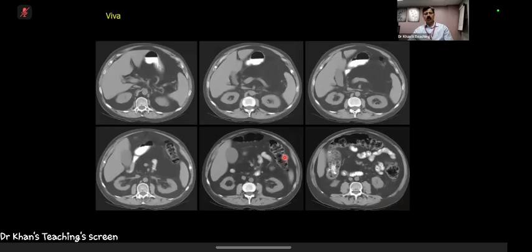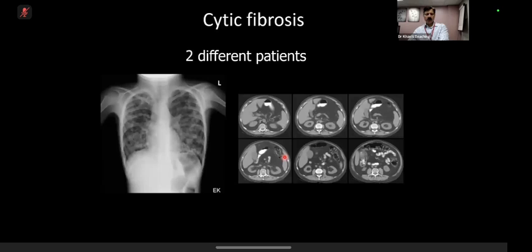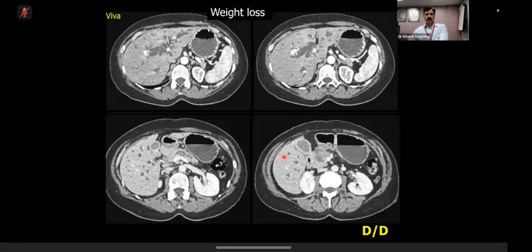Excellent. So here, in the exam scenario, this kind of a case becomes very difficult to pick up because something is absent and the human mind does not go into it. Basically, the pancreas is not there. There is just fatty atrophy. And usually it can be seen in a patient of cystic fibrosis, and it can also come in the exam as a long case.